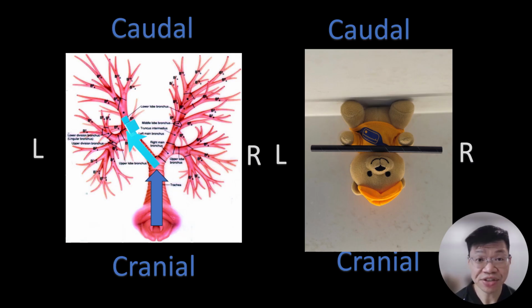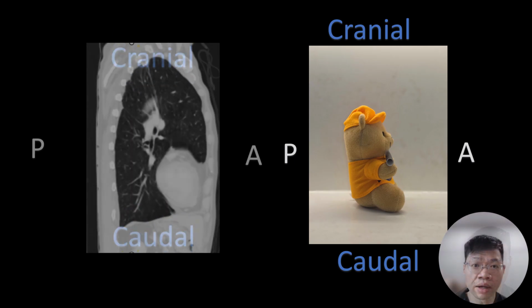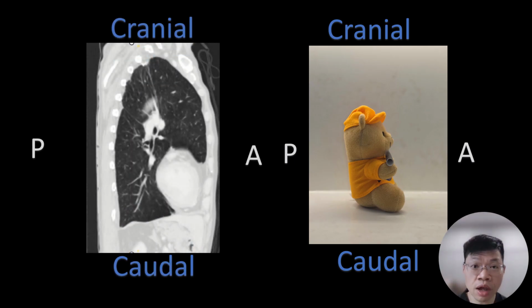Since we know that after entering the LB6, our bronchoscope will continue to follow the airway to the nodule in the medial to lateral direction, we can hence continue to use the sagittal view to help us to view the tubes as circles. This would thus be our expected view on bronchoscopy with the spine posterior and the heart anterior, correlating to the CT scan, the flipped sagittal view with the spine posterior and the heart anterior, which is the same orientation as our bronchoscopic view.